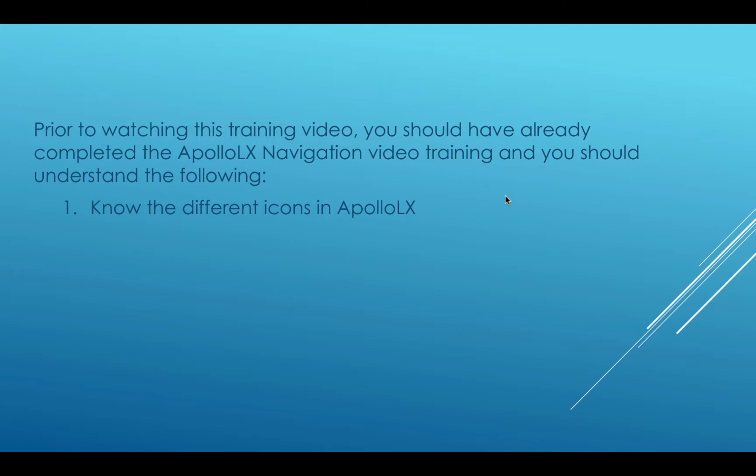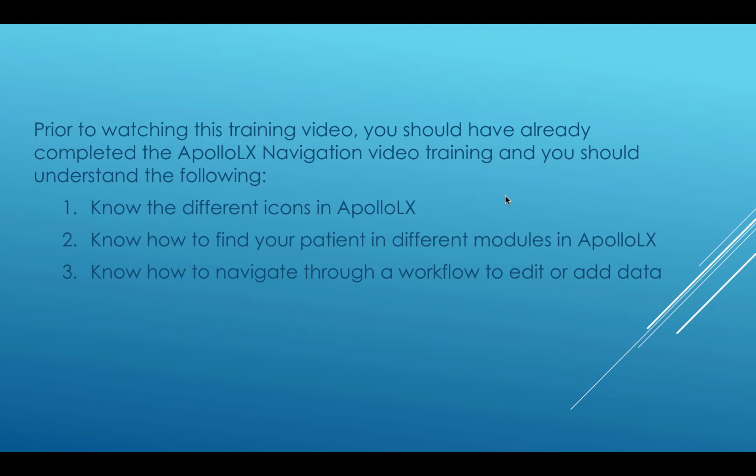understand the following. 1. Know the different icons in Apollo LX. 2. Know how to find your patient in different modules in Apollo LX. 3. Know how to navigate through a workflow to add or edit data.